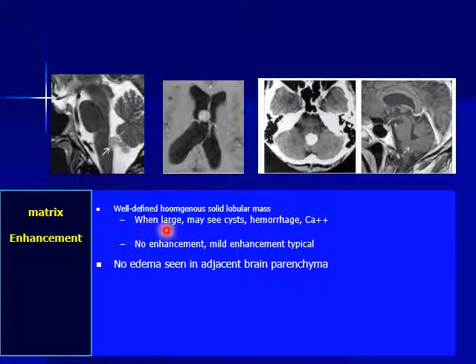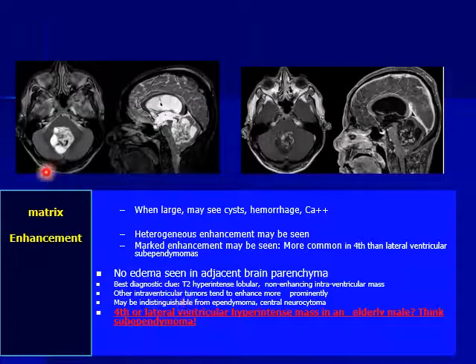But when the tumor becomes enlarged and more heterogeneous, you can see heterogeneous enhancement. But the clue is the age. Sometimes these tumors become markedly calcified, okay, giving this extensive calcification within the lesion, which is sometimes called intraventricular brain rock or brain stone. It is benign, so we don't see edema surrounding it. Sometimes, as I've told you, if it gets much enlarged like this, it becomes heterogeneous with areas of hemorrhage and calcification, and you can see heterogeneous enhancement.